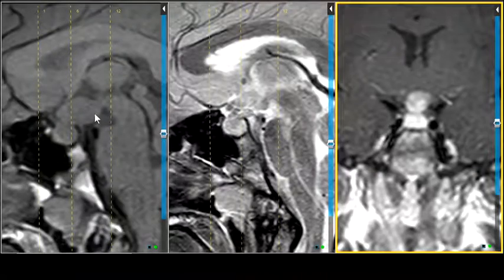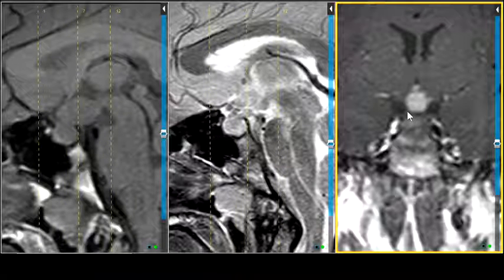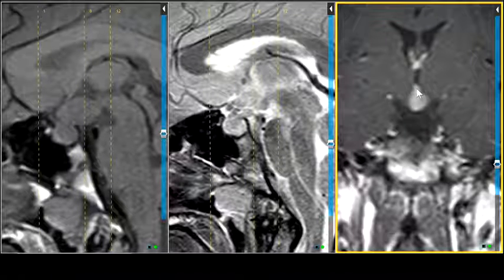Yeah, hamartoma's out. You like those to be more in the region of the tuber cinereum. The epicenter should be a little further back, closer to the mammillary body. I think the epicenter's over here. Hamartomas don't enhance. They're usually associated with gelastic seizures or behavioral change, or sometimes they're associated with growth delay, occasionally with epilepsy. But diabetes insipidus can occur with a hamartoma, so that certainly doesn't rule it out, but it points a little bit more towards germinoma. I'll tell you what else points a lot more towards germinoma besides the enhancement. Is this little funny nubbin of growth superiorly headed towards the third ventricle.